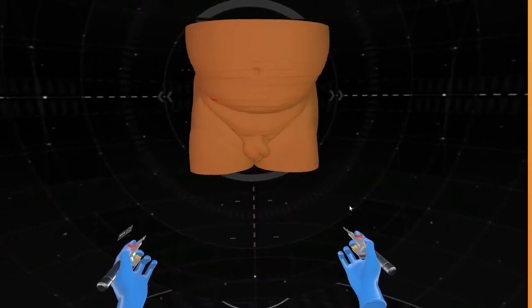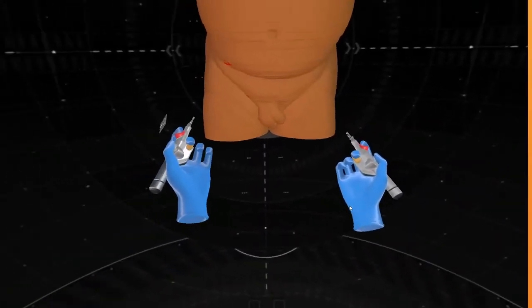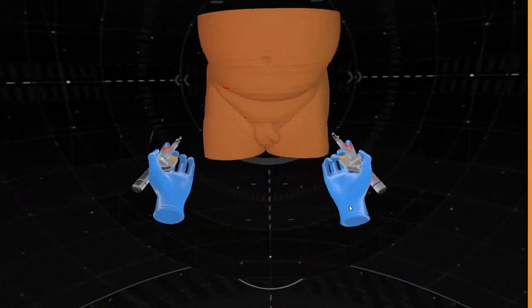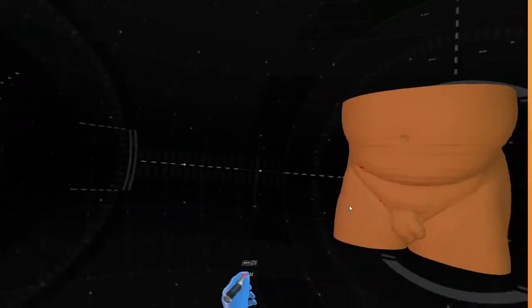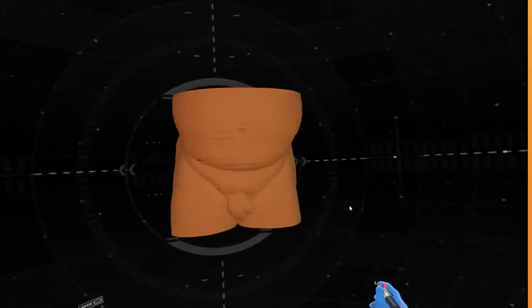The user is placed in a virtual space and is able to manipulate their surroundings with handheld controllers. Although this is difficult to represent in 2 dimensions, the user will have the visual perception of being fully immersed in a 3-dimensional room.